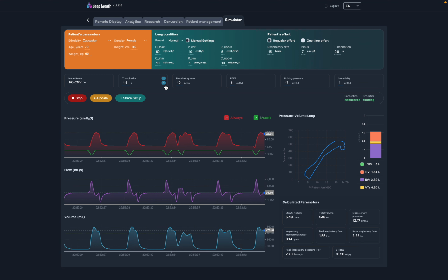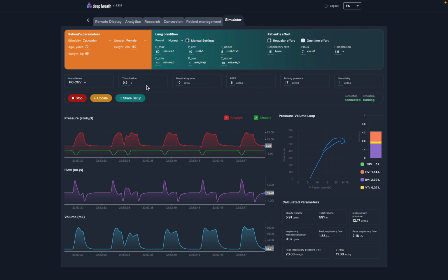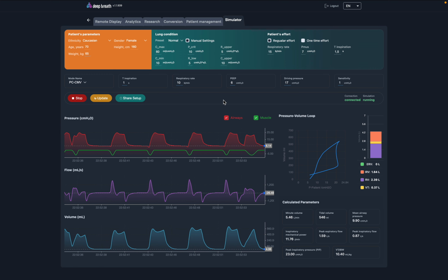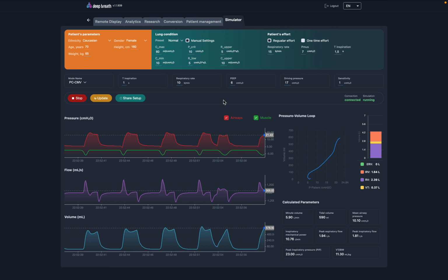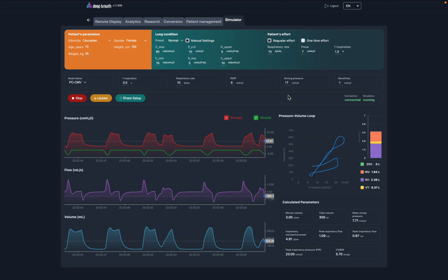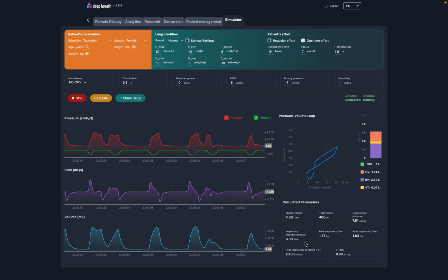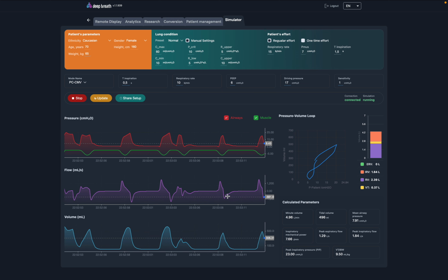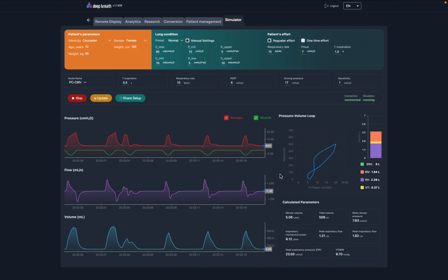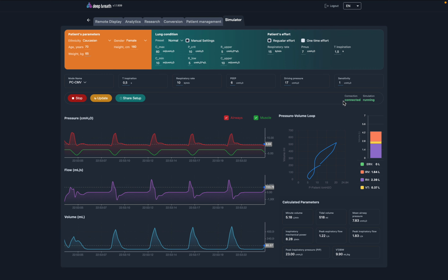Oh, sorry, I missed it. So I wanted to make it otherwise. So I again make it a little more early cycling. Update. Now let's reduce more. And we see that the calculation is always done. Yeah, so we see here is simulation of early cycling, exactly how it should be. So we already reproduced two types of asynchronies. And I think this is quite interesting.